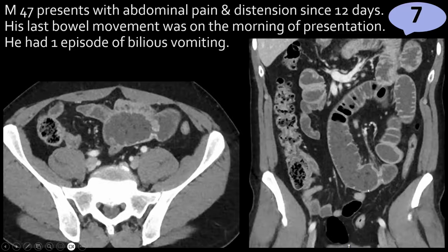Yeah. Is it just one site or are there multiple? I mean, thinking diaphragm disease in the differential. Perfect. Yeah. There were 2 or 3 of these, and this is a very short segment, very focal. This is diaphragm disease. So what could be the differentials for those? Why should the patient have diaphragm disease? Cause? NSAIDs. Perfect. The patient was not on NSAID.